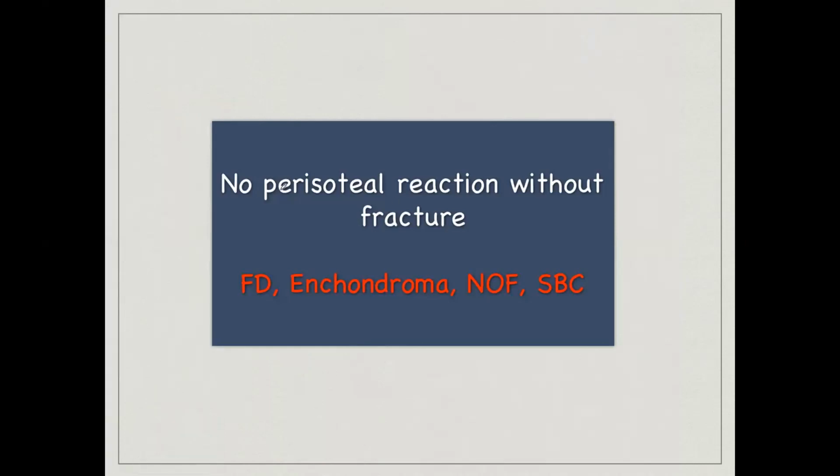So remember, no periosteal reaction without fracture in these lesions. This is something which you need to remember. So these are all non-aggressive lesions and they should not usually have a periosteal reaction unless you see a fracture associated.